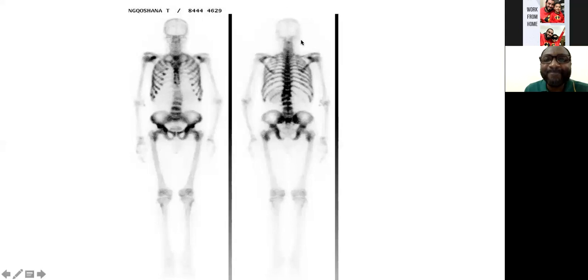The history is probably indicative that they have prostate cancer. So the history of prostate cancer. From the image, what is against metabolic bone disease? Two important things against metabolic bone disease: it's affecting mainly the vertebrae without affecting the skull. And in metabolic bone disease, remember you usually have costochondral uptake. All right. Good.